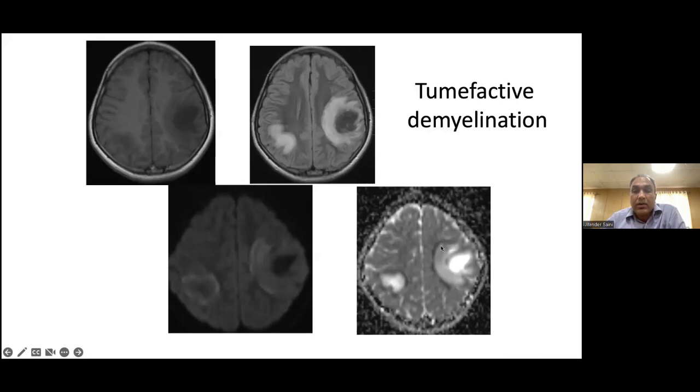And the intermediate structures show some hyperintensity, for example in this area. So this kind of peripheral zone of hyperintensity and then a central necrotic area showing a diffusion restriction pattern of this type. If we give contrast to these patients, this will show a vague enhancement. The same exact area which shows diffusion restriction will show enhancement. And also the morphology of the lesion is very unique.